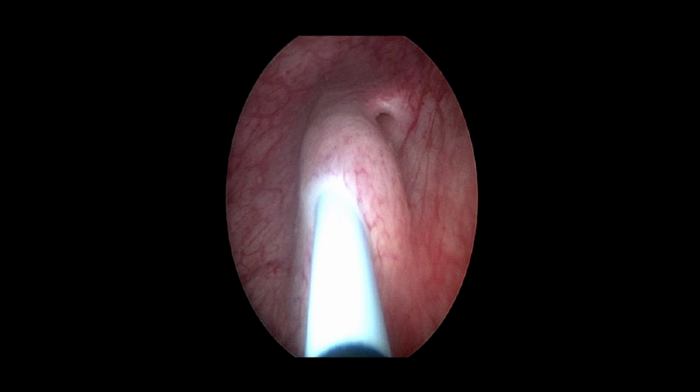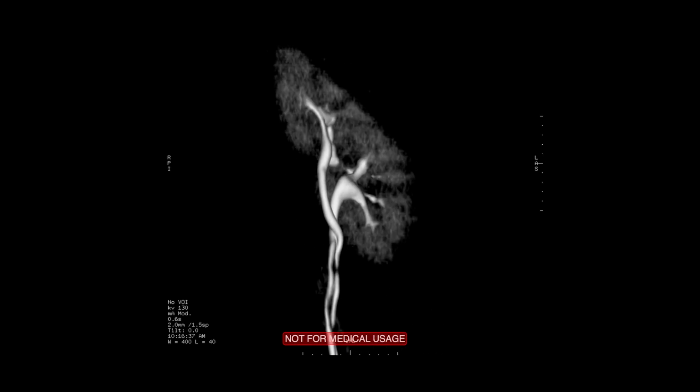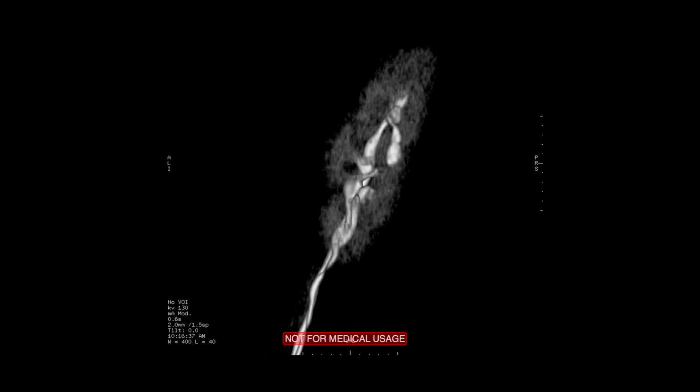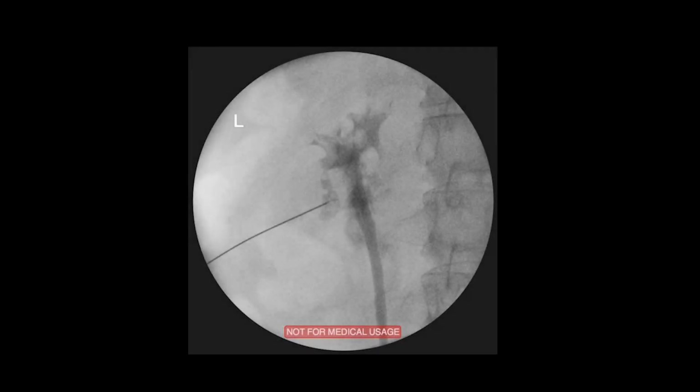And I think this was the ureteric orifice that was accessed at the first operation when ureteroscopic access to that diverticulum was achieved. So the next question then is, how are you going to manage these stones which are in a calyceal diverticulum? You can see the diverticulum is absolutely tiny, and our standard access of 26 or 30 French, I would say, is going to be too large to access that diverticulum. And that's where having maybe something like ultra mini or mini PCNL is a good option.